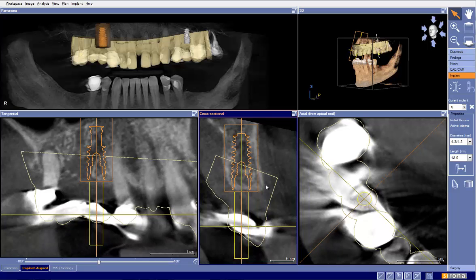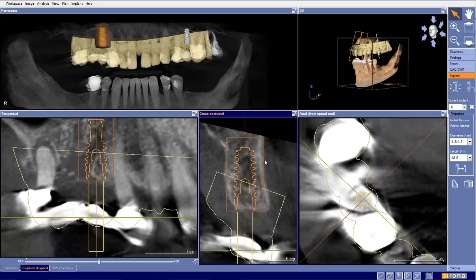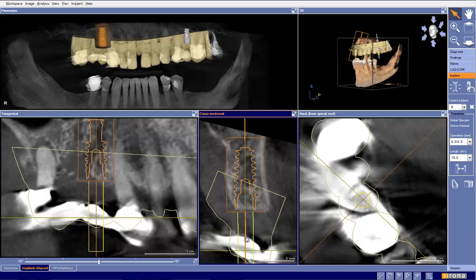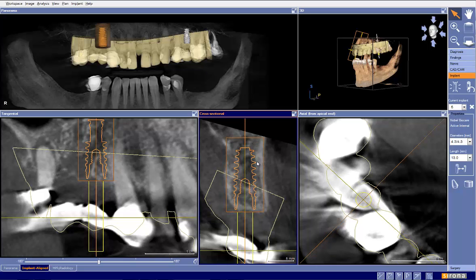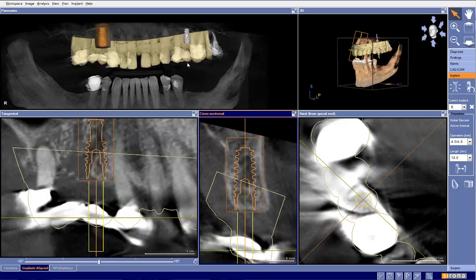You know, ideally maybe we would go right about there. Actually, this is a good lesson here. Instead of taking it from the head of the implant, I would actually take it from the apex. And the reason I take it from the apex is we're pretty, I want to use the word thin here, but we're close to our edge, but we have more space here to the palate. So I would have a tendency to take this from the palate a little bit so that we maintain more bone there. But again, for the overpartial, we'll leave it kind of right where it is.